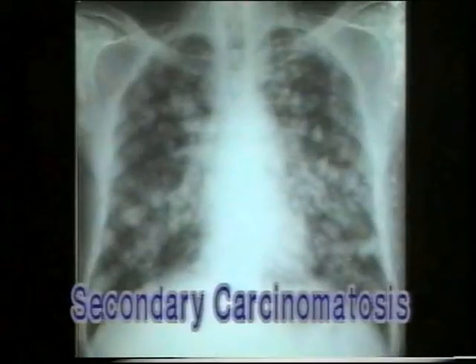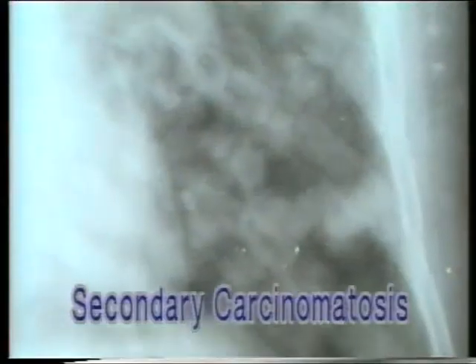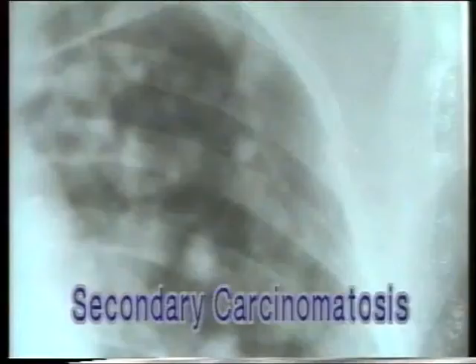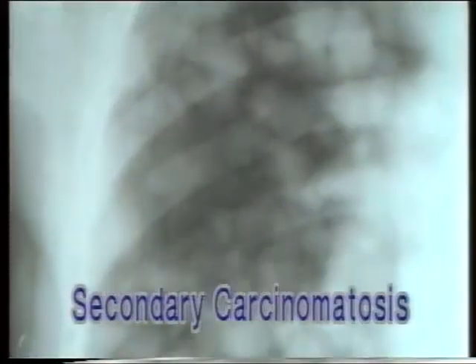Secondary carcinomatosis. This X-ray shows both lung fields riddled with small opacities of varying sizes. This is termed miliary carcinomatosis or secondary carcinomatosis. In contrast to miliary tuberculosis, here the opacities are larger, less numerous, not uniform in size, and may be confluent.